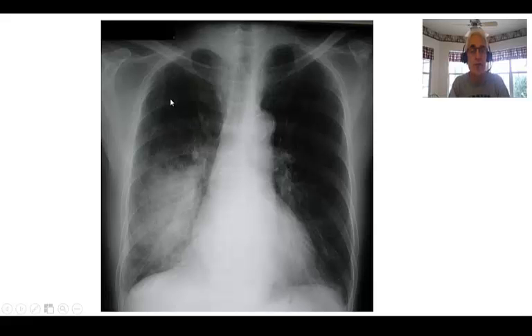Here's a patient. This is a 50-year-old smoker presenting with fever and cough. It's been going on for about a month. Airway looks okay. The bones, patient's turned a little bit to the right. Not too bad. Cardiac shadow looks good. Diaphragms look okay. There's no effusions, no free air, gastric bubble we can't see. The hilar markings are good, but look at this.